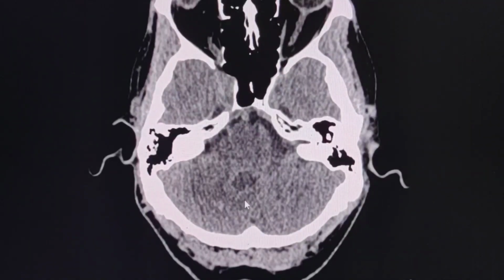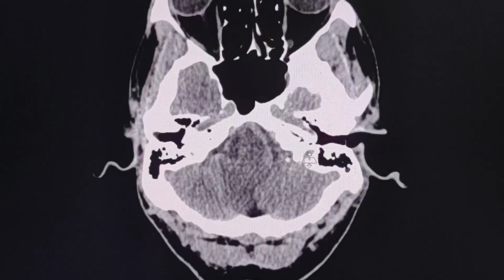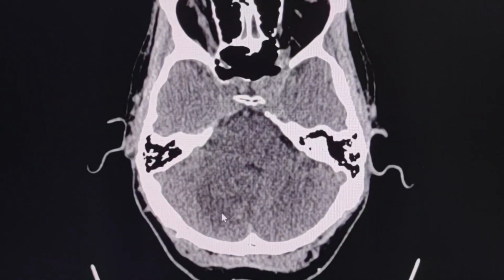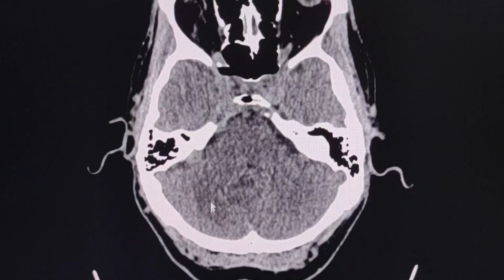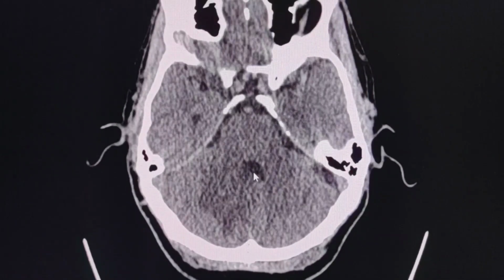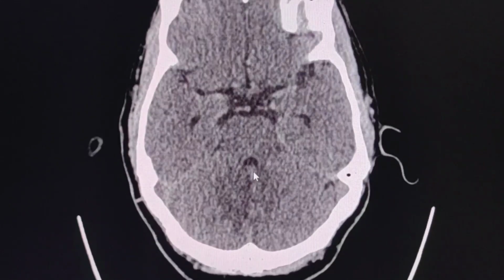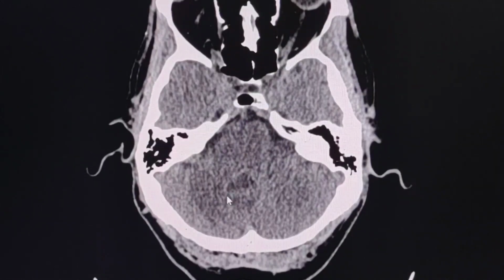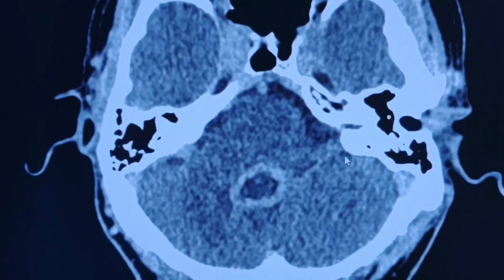A CT scan was done in the emergency department, and what we can see is that the perilesional edema in the right cerebellar hemisphere is increased, and there is a degree of effacement of the fourth ventricle, and these findings can explain the clinical appearance of the patient. Here is the post-contrast CT scan.